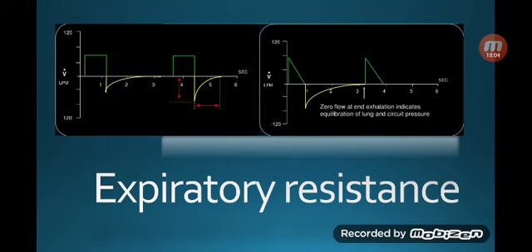What about the expiratory limb? Expiratory limb is really useful to tell you something about the pathology of the lung, because the time that the lungs need to get all of the air out would tell you something about how high is the resistance against that air to go out.